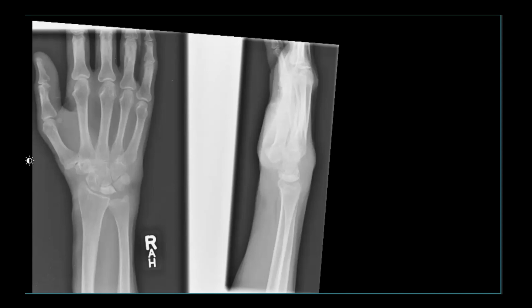And I would convey this to the referring physician and also ask him if there are any etiologies which could explain this, whether the patient is on steroids or whether the patient has had any previous fracture, and review any previous radiographs for the same.